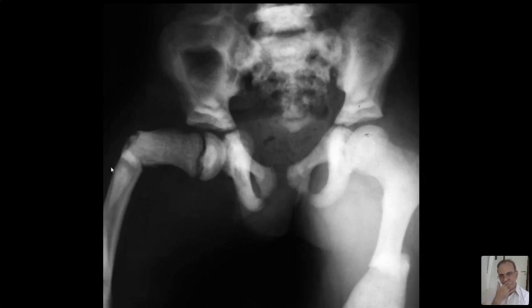Now, if you look at this film of pelvis with hips, if you look at the acetabulum, the supraacetabular region, you have bone within bone appearance. I get fascinated, not because it looks beautiful, but because there's so much bone pathology behind it. Now you see the fractures in this patient, right? These are horizontal fractures. These are not oblique fractures. What I mean by horizontal is that you take a ripe banana and break it, right? When you take a ripe banana and break it, try as much as you will, you can do it to a whole lorry load of ripe bananas, you cannot break it obliquely.